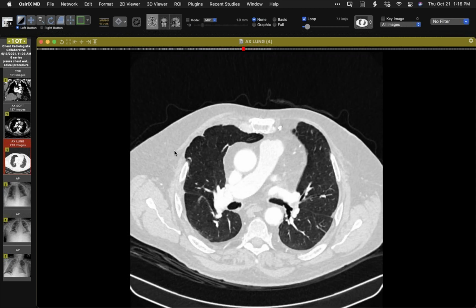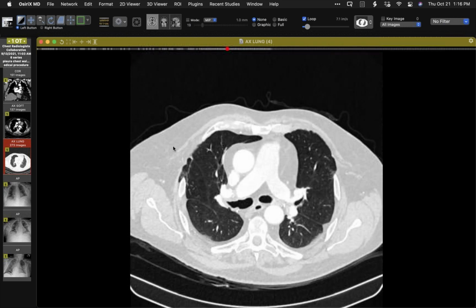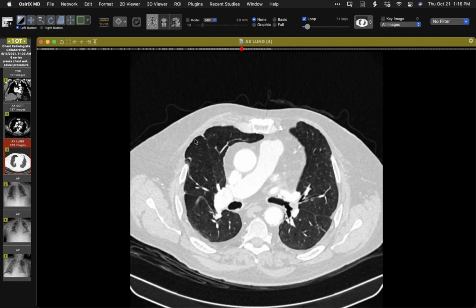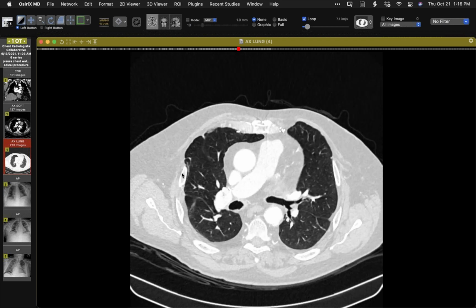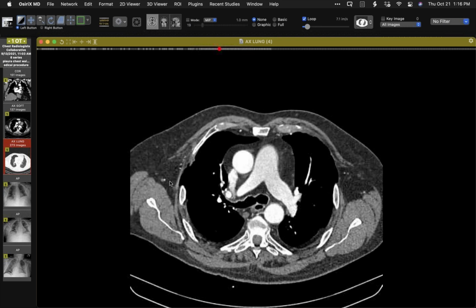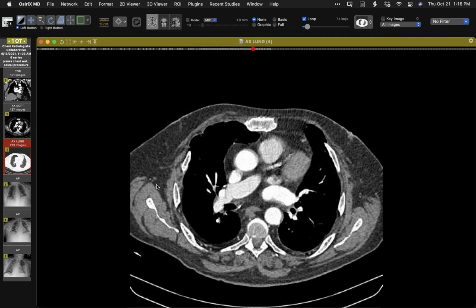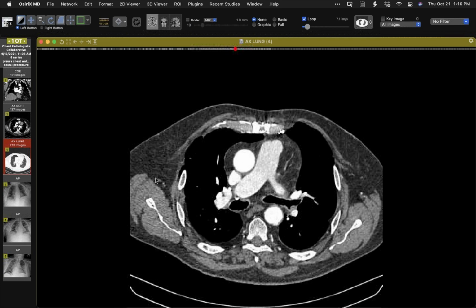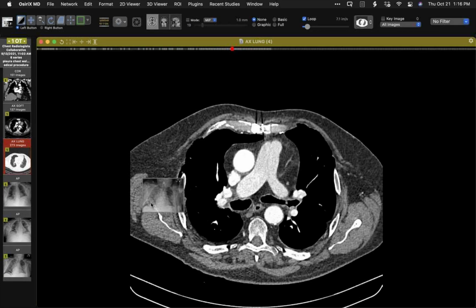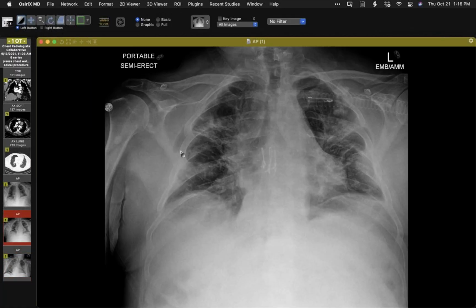Have you seen that before, Jeff, at your place, or anyone else, in relation to the incision? Yes, I ascribe it to that. Quite frequently, especially in some of the lung transplants when they do those clamshells. Yeah, you see there's very little intercostal muscle there, like right there. Yeah. So just a curiosity. And I've seen a few on radiographs, like if they come for just post-op or clinic, you can see that hernias are dynamic. Okay, yeah, there.